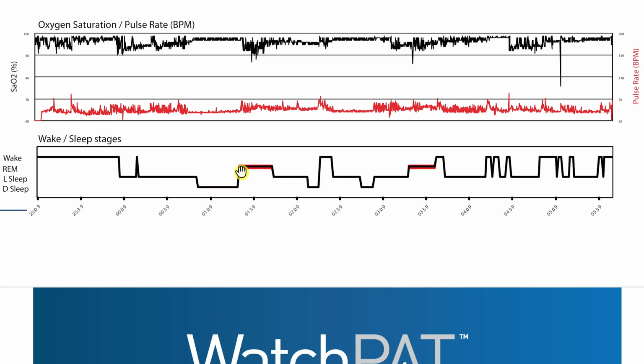And we're in REM from like, let's say 120 to 140, 50. And then we go down to light sleep. And then we go down to deep sleep, right? Because that's lined up with deep sleep. And then we go up to wake. We're awake. Down to light sleep. And so on and so forth. I'm not going to do these. You can see that these are waking up. This is being awake, waking up, waking up, etc.